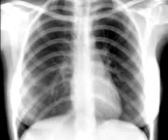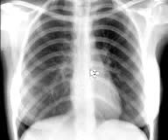Vessels are bigger near hilum and are getting smaller and smaller towards the periphery. So the vessels are bigger here and they're getting smaller and smaller towards the periphery. Lower lobe vessels are bigger in diameter as compared to upper lobe vessels here. Left and right main bronchi. Let me show it to you once again.